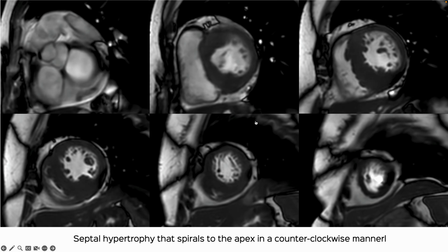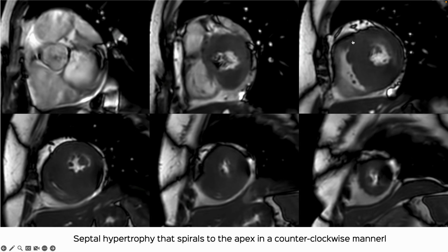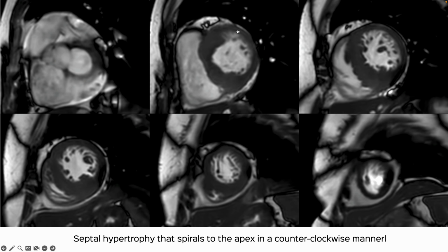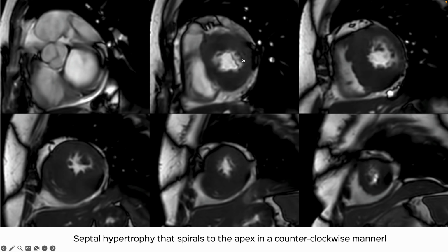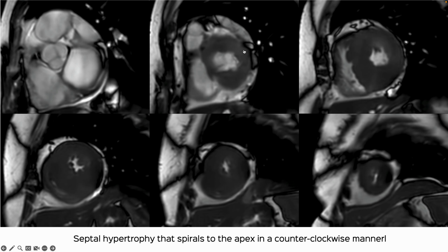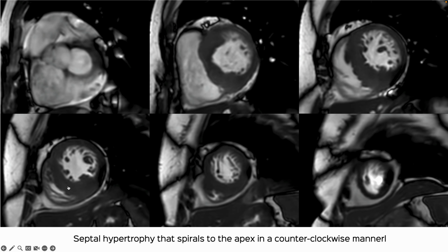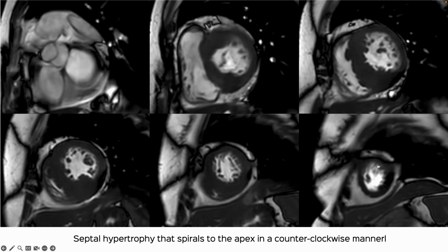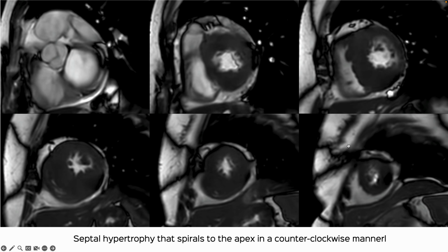This is the short axis that shows the septum to be hypertrophied, and if you can imagine it, from the base to the apex it's a spiral that goes counterclockwise, so it actually moves in 3 dimensions from the base to the apex, starting in the septum, going along the mid inferior wall and then the apical lateral wall. So that's the typical presentation of a septum predominant HCM.